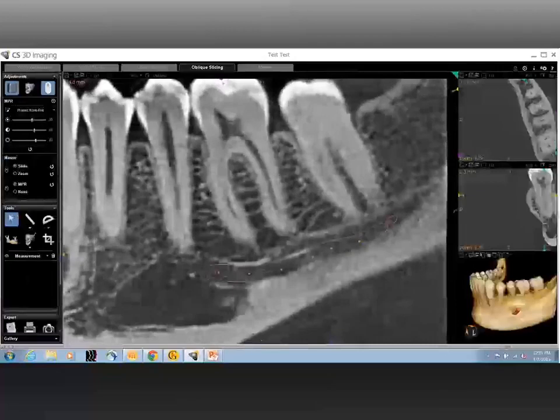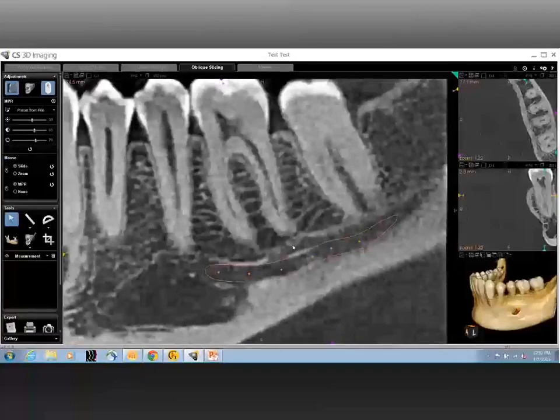Excellent. So radicular anatomy and proximity of the apex of the teeth to the nerve canal. These are very important. Now, I understand dentists are interested in visualizing the PDL and PDL-related structures. So which are the most common non-implant related findings commonly visualized in scans of the mandible?